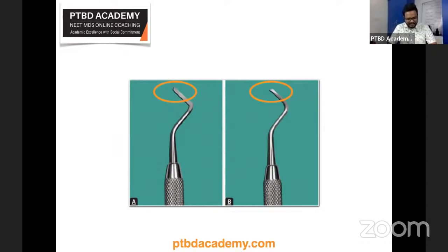Very good. Sonali, yeah. A is distal, B is mesial. Yeah, you can say that in terms of acute angle, as Swati has mentioned. If you have those numbers, yes, acute angle is mesial, as we have seen, 75 to 85, and obtuse angle is distal. In whatever way you remember, it's completely your choice. Yeah, cutting edge away from the operator, in the sense of when you hold the instrument in this particular fashion. In terms of the long axis of the instrument, yes, cutting edge away from the long axis of the instrument is distal. Excellent. You can have your own ways of remembering and identifying.